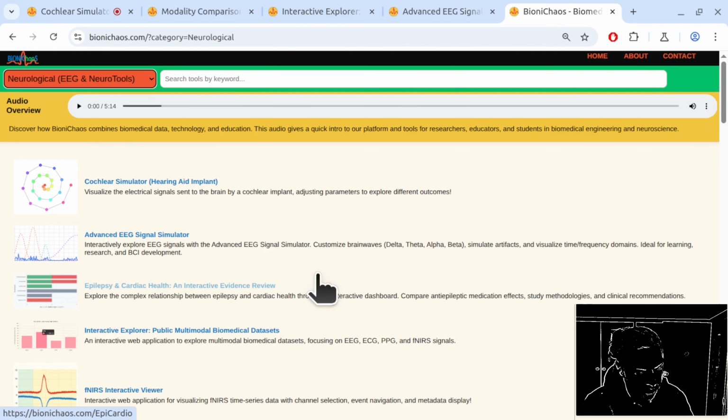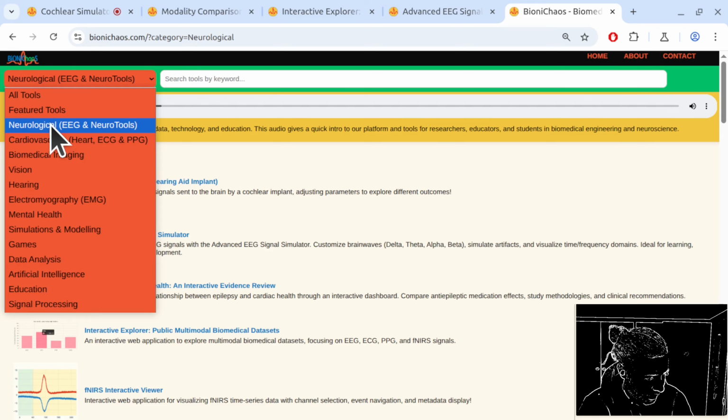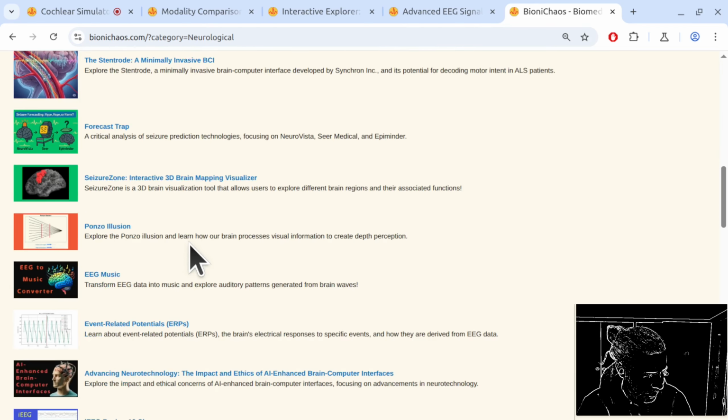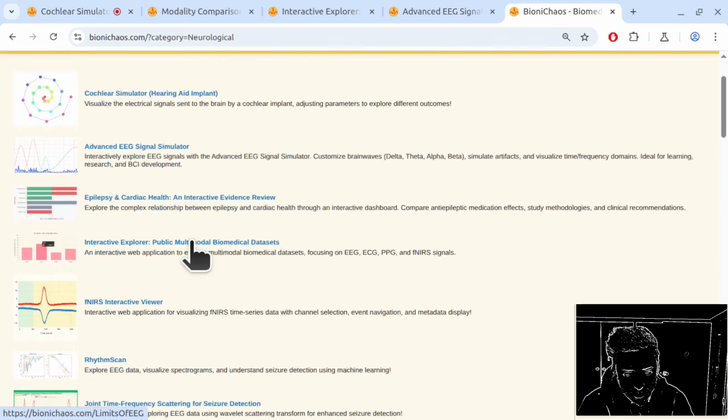Okay, and how does it compare to what you currently see on the screen? That's the landing page, with the pre-selected neurological web applications that we have. Can you give a quick overview, looking through it? Don't mind you being critical.